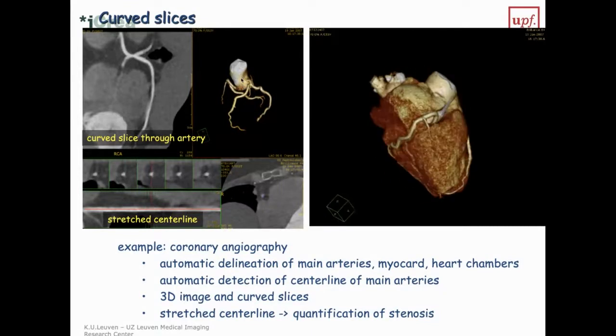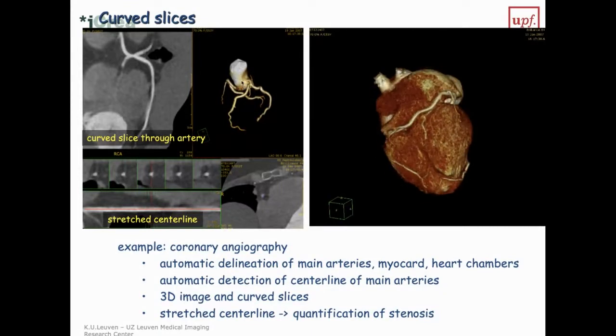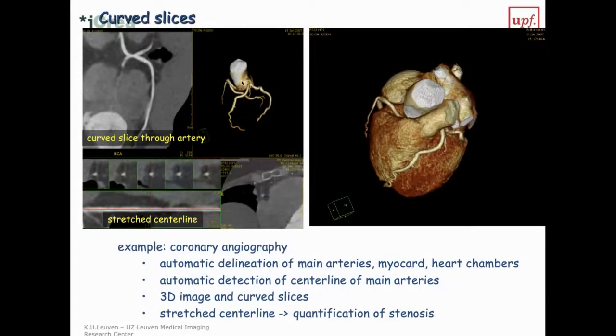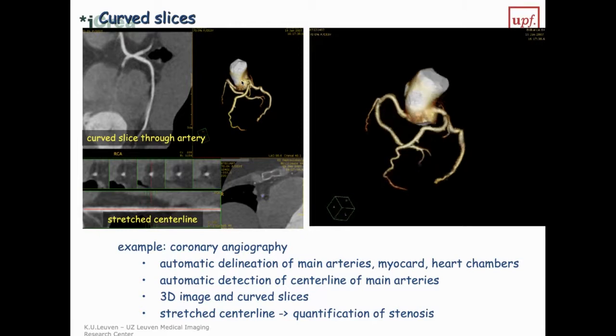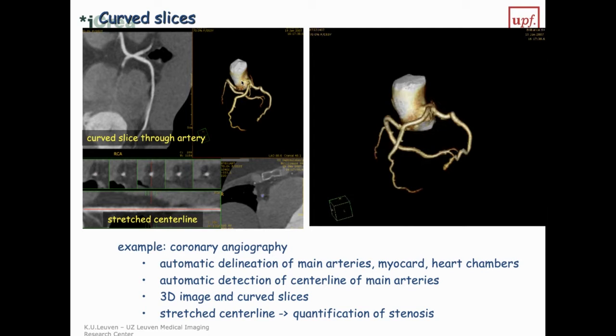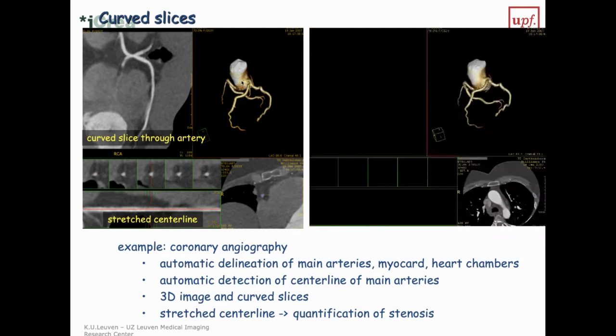Here, the advantage is that you do not need to do this inside the coronary. The problem with catheterization is that because you're using projection, everything would project on top of each other. With CT, because we really have a 3D volume, we don't care if there's also contrast in the venous circulation, because we can actually separate it.